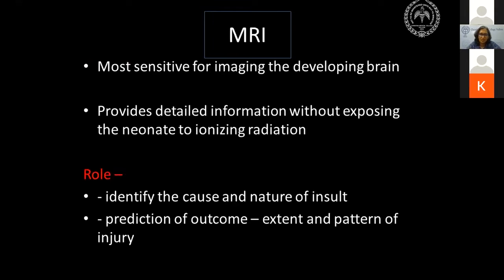As we all know, MRI is probably the most sensitive imaging modality for evaluating the developing brain. It provides detailed information without exposing the neonate to ionizing radiation. The main role is to identify the cause and the nature of insult, and also to predict outcome based on the extent and pattern of injury.